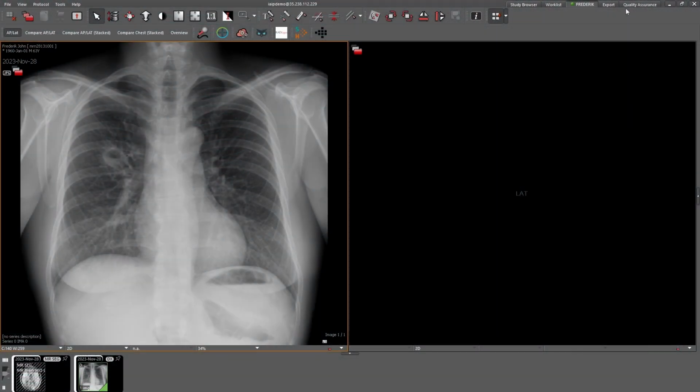We will walk you through a clinical scenario of two patients, the first of which comes into the ED for left-sided weakness. Then we will follow our second patient in the outpatient setting. For the purpose of the demo, the images may not line up perfectly because they're actually from different patients.